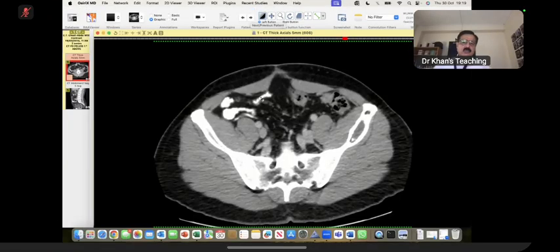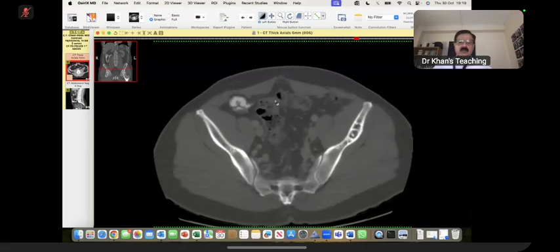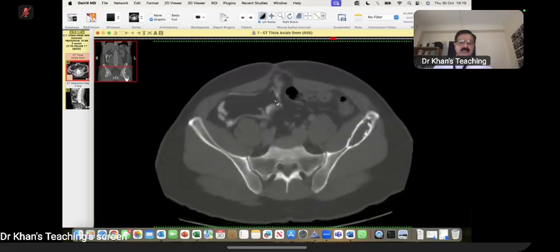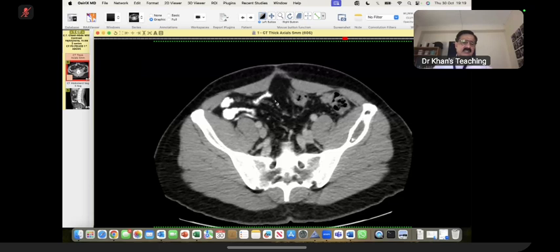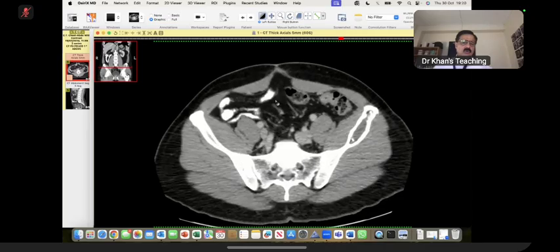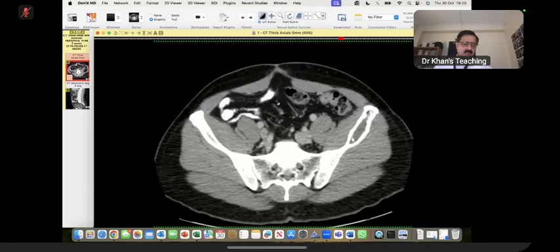And in the end, you did ask for a CT, so I showed you a CT. Actually, there was no need of a CT, but CT shows the same thing. And the key point from my side is that in your exam, for bone tumors, never ask for a CT unless it's an osteoid osteoma, nothing else. In the real world, of course, we use CT, particularly for planning, etc. But use plain film and MR. So in the end, your final conclusion once again was simple bone cyst.